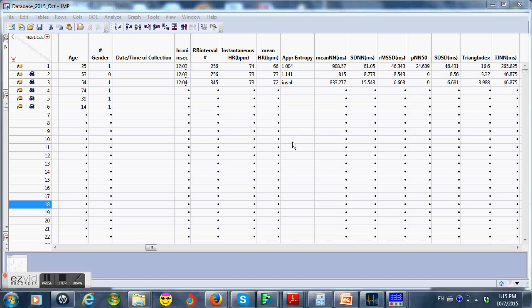Here, we're just going into one of our databases, a statistics database, just kind of showing you. You can see the ages and the genders there of the patients that are in videos 1 through 6 in chronological order there. And you can see their ages and gender. Gender 1 is male and 0 is female. We just had 1 female, the second patient.